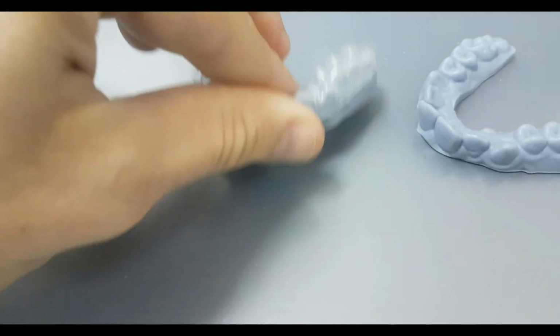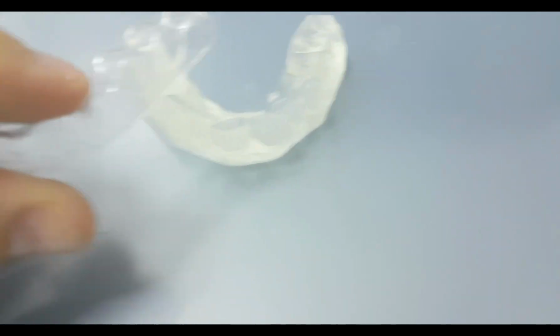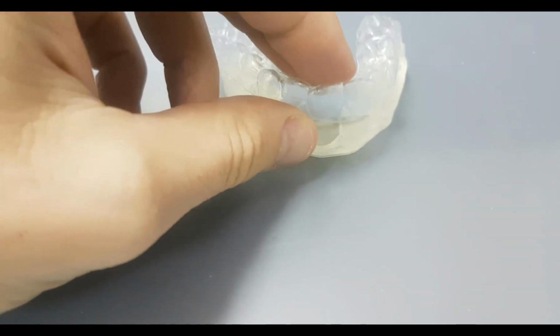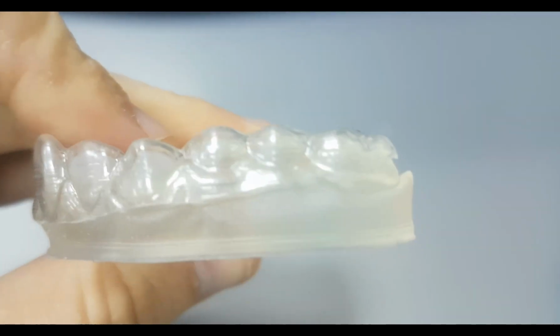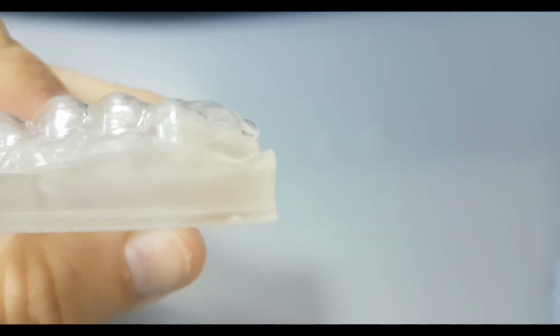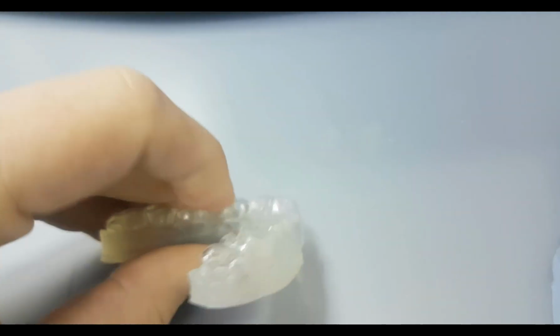And I finally checked it with the certified printer and material to see if it could have been the same mistake on both other models. But in this case, the deviation was almost exactly the same, which leads me to conclude that there's a problem with the quality assurance and the process for the creation of this aligner.